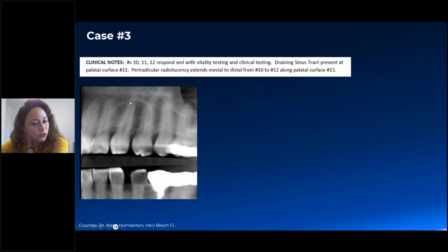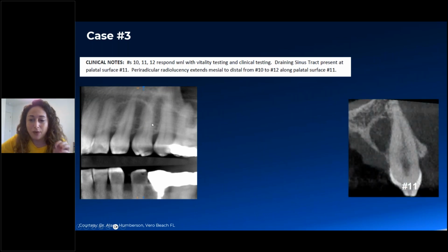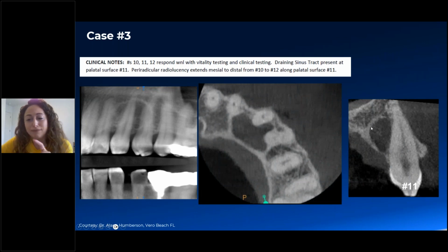Whereas on that panoramic reconstruction, we could see a radiolucent, or low density, area in the anterior left maxilla. Now, it's easy to take a scan, look at number 11, and assume this can be a lateral rarefying osteitis, so a lesion forming around the lateral aspect of the radicular surface, versus something else. But if we look at the axial view, you can see that the lesion is not really focused around number 11. The epicenter is not number 11, but it just happens to scallop around it.